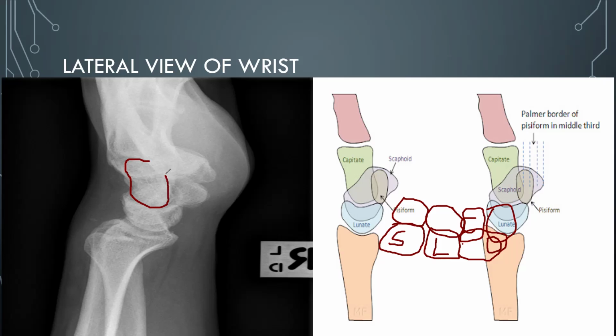If you can follow my diagram, it's more or less there, all right? And then if we look at this, this is the lunate. Now lunate because of moon, all right? So lunar, lunate, all right? So that's what we're looking at. And then we're looking at the top of the radius.